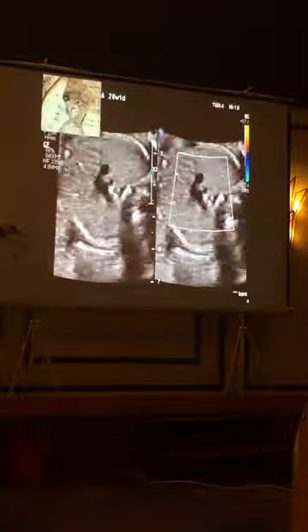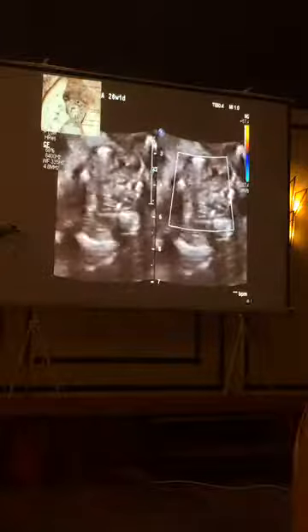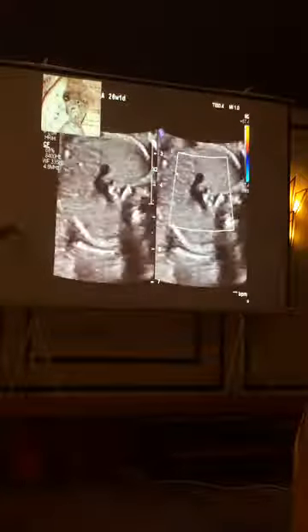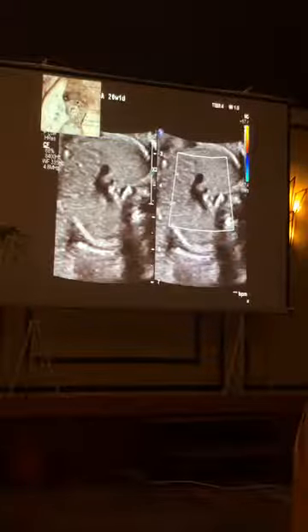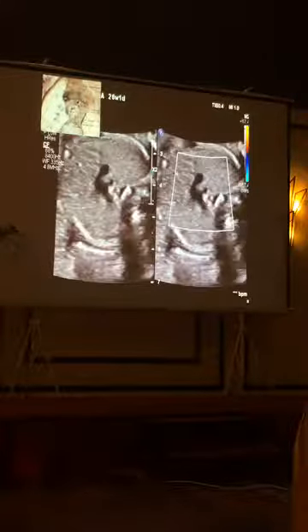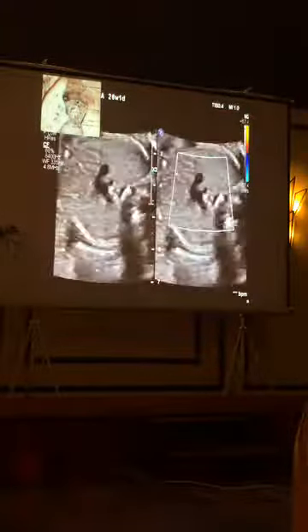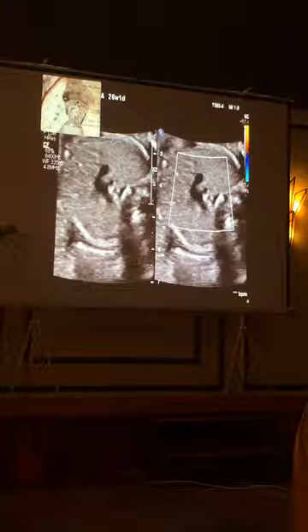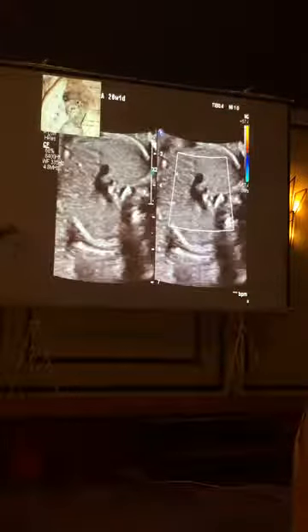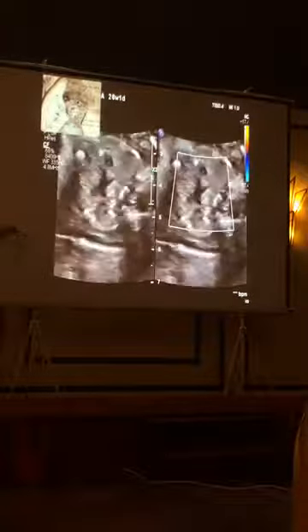So, when you look at three vessel views, first of all, you have to make sure that you are looking at a proper scan, because a lot depends on your angulation of the transducer and how high you are in the chest. So basically, as Gordon emphasized a couple of times, the best way is to do a sweep and start from the abdomen, scan up to the three vessels view, because then you will have the overview of everything, just like pick up an image and try to interpret this.